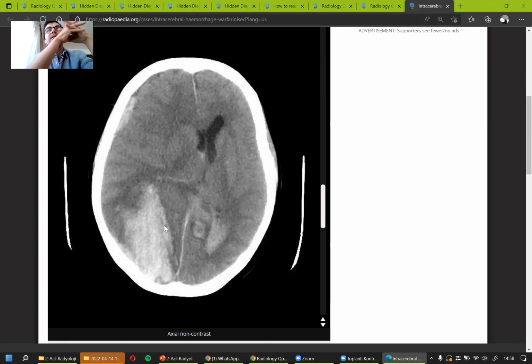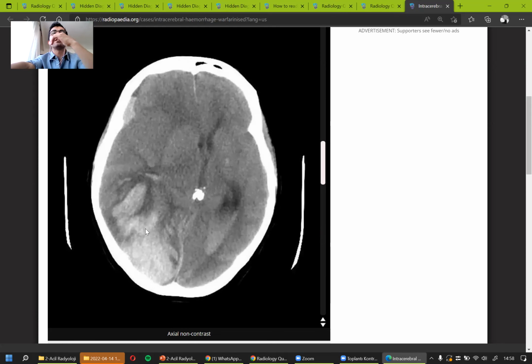Hematomas in CT scans are usually brighter than the normal tissues because they have a lot of hemoglobin inside, a lot of thrombocytes inside, and also a lot of fibrin. Those proteins, the thrombocytes and the erythrocytes, make up a very dense mass, which is high on protein. So it is usually bright.